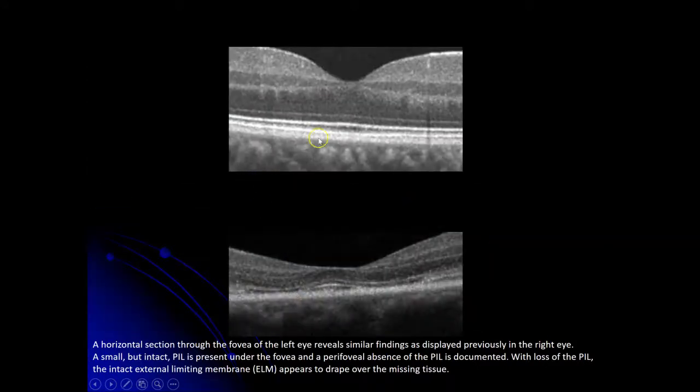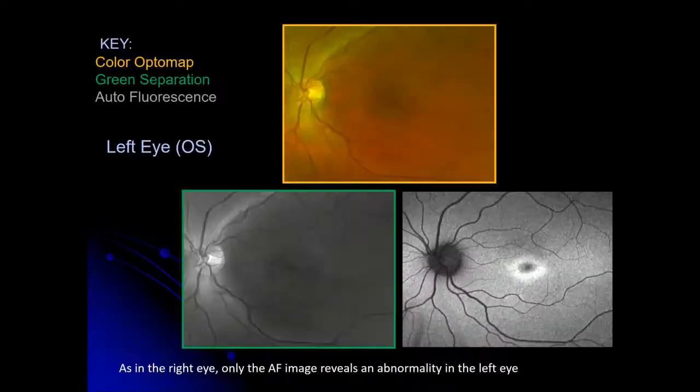Here's the other eye for comparison. Again, the PIL should go entirely across, as you can see here. And here, the PIL is present under the fovea, but missing in both directions. So this would be typical for something like Plaquenil toxicity for somebody who's on Plaquenil. Could be also cone dystrophy, could be Stargardt's disease, could be something unusual like Accutane toxicity, which may actually be the instance in this case.